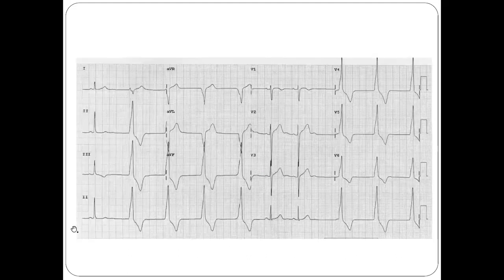Suppose this is a normal PQRS-T: this is a P wave, QRS and T wave. And you can see here this is the ventricular generated beat. There will be no P wave here. This is the R wave and only an ST wave. This is a ventricular generated wave, and this is called a ventricular premature contraction.